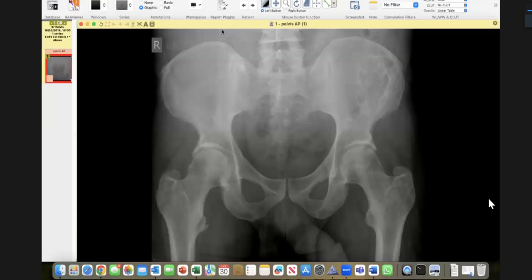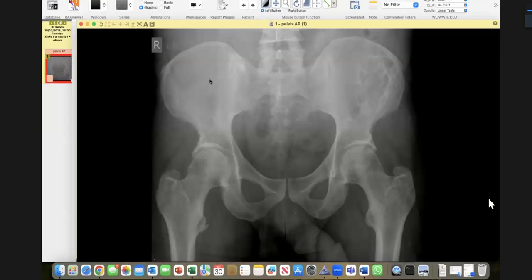I was muted. So this was your first case. Now, key thing: 53-year-old male, and you picked up osteoarthritis. By the way, there is a cam type of deformity here. I don't want to go into details. You can see a bump here at the neck, and for a 53-year-old, the OA is quite advanced, and this is because of the cam type.